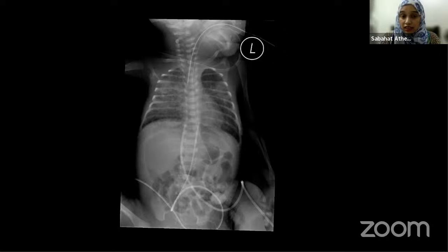And you know, sometimes the examiner will put these only for the case of tubes. He will not care whether you pick up the RDS or not. But yes, there is an endotracheal tube, there is an umbilical venous catheter. What else is there? Oh, sorry. What else is there? Okay, let me show this.